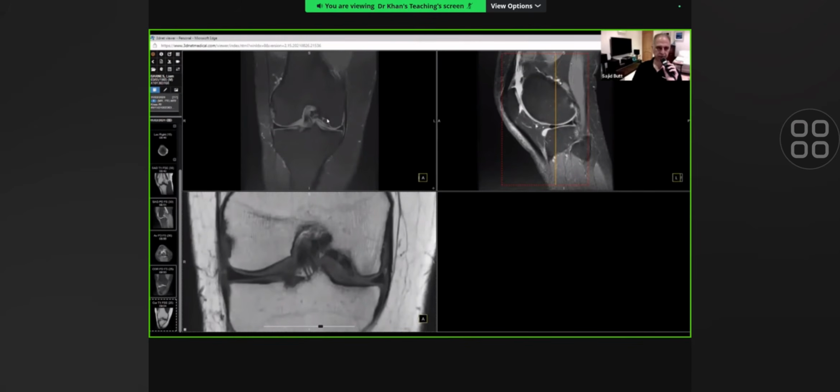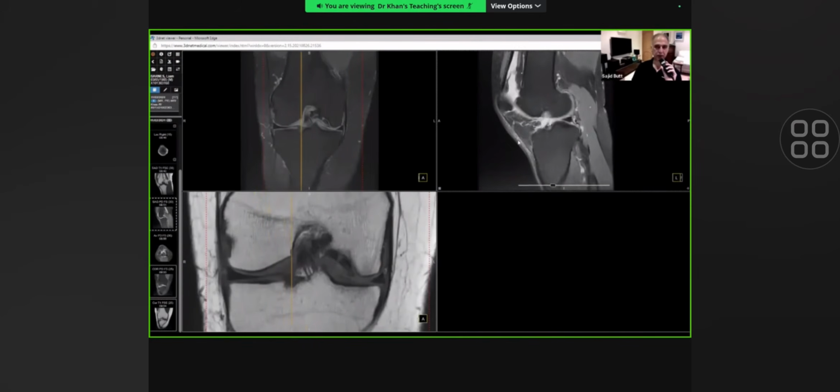Because he's quite old, he must have developed this when he was younger, and he's been carrying on with it. Therefore, the osteochondral injury has become showing signs of necrosis, but at least it is stable. By stable, I mean that when he moves around, this is not flopping around in the knee joint. It's still holding in its place, but this is not normal, and he would need some sort of a surgical repair.